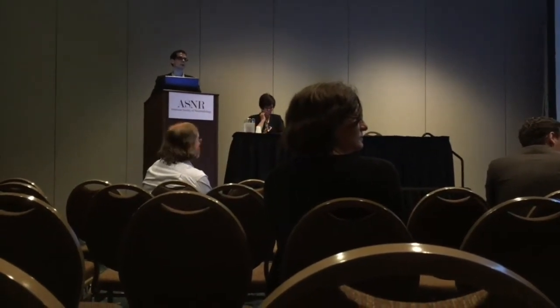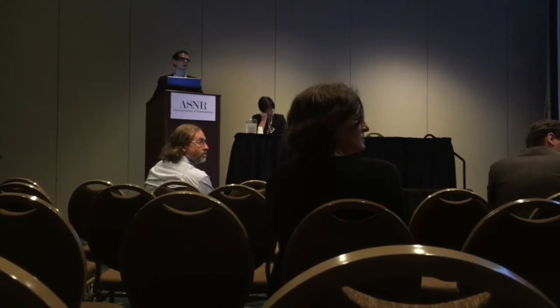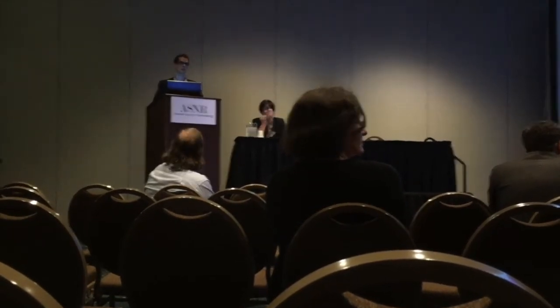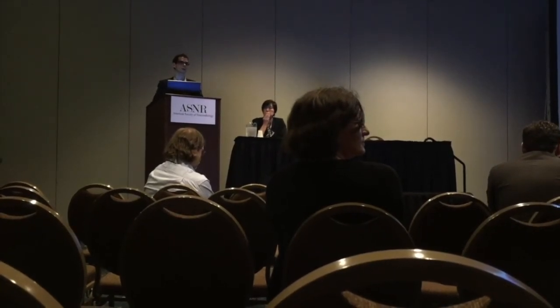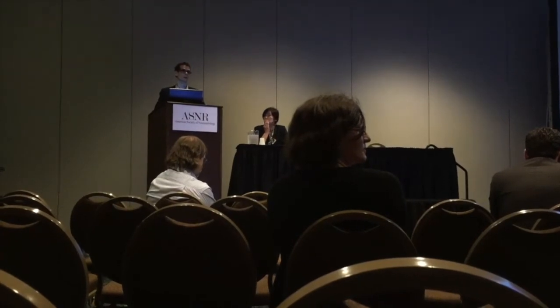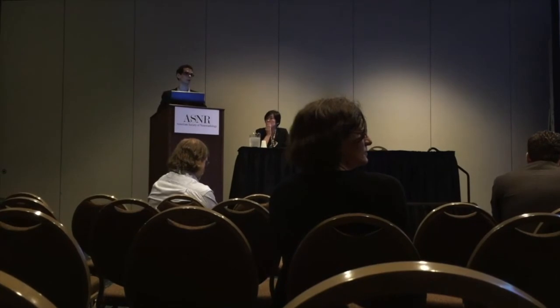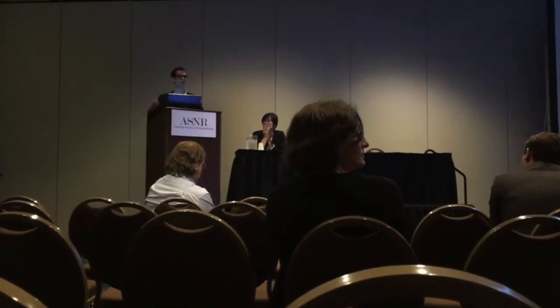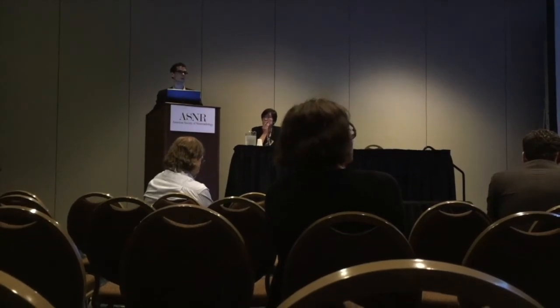Does this have volumetrics capability as well, or would that be a separate thing? It's a separate thing. This does not do volumetrics at all. There's nothing in syngo.via for us to make volumetric assessments. It's another software, another post-processing tool.